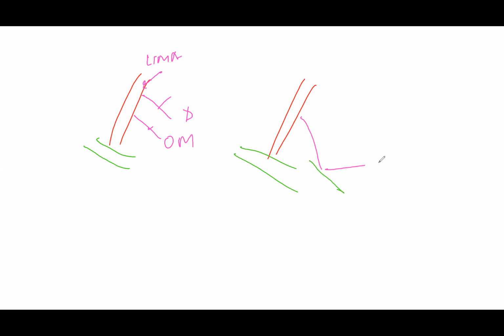So there's a vessel here, there's a vessel here, like OMs. Usually it happens to the OMs. And you can keep on having sequences in here. It's sometimes called a Y graft or Y sequential graft. Sequential graft. And it depends on the surgeon how he looks at it. He can call it a T graft as well.